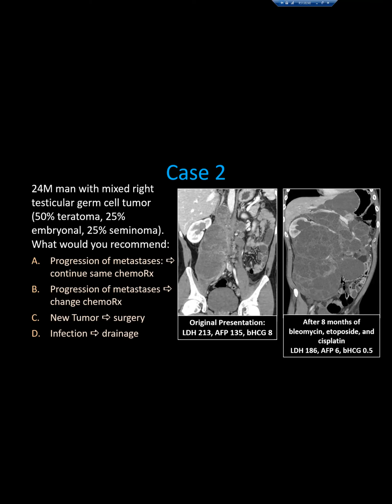When I see this, what comes to my mind is growing teratoma syndrome. And if that is the case, then those are resistant to chemotherapy and they have to be surgically managed. Very good. Excellent. So the points to make are there is this tumor that has suddenly grown. However, all the malignant markers, which is the AFP and the LDH, are all down. So why is the tumor growing when, apparently, it's looking better on the malignant side from the lab test? So yep, that's the correct answer.